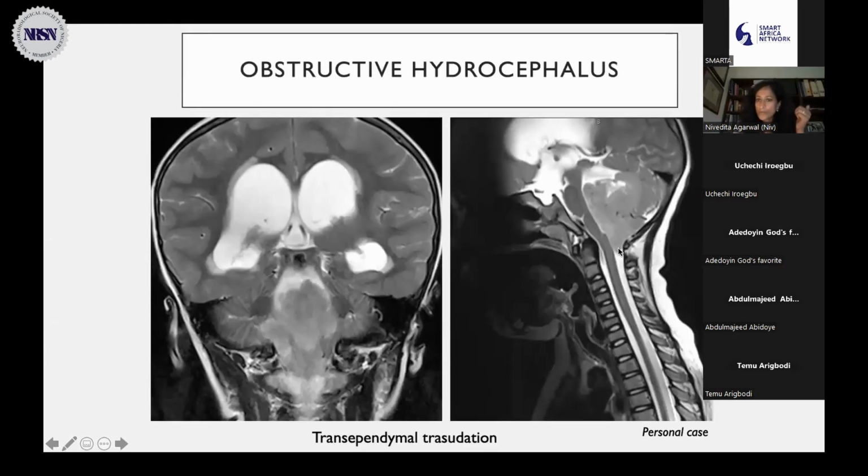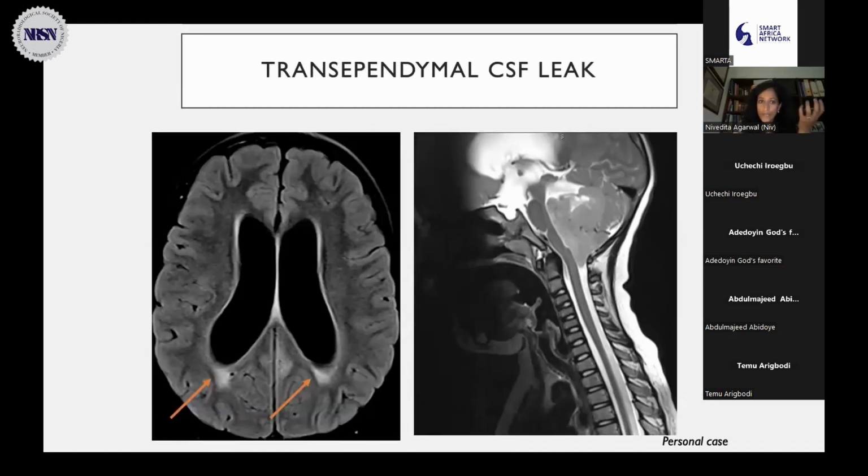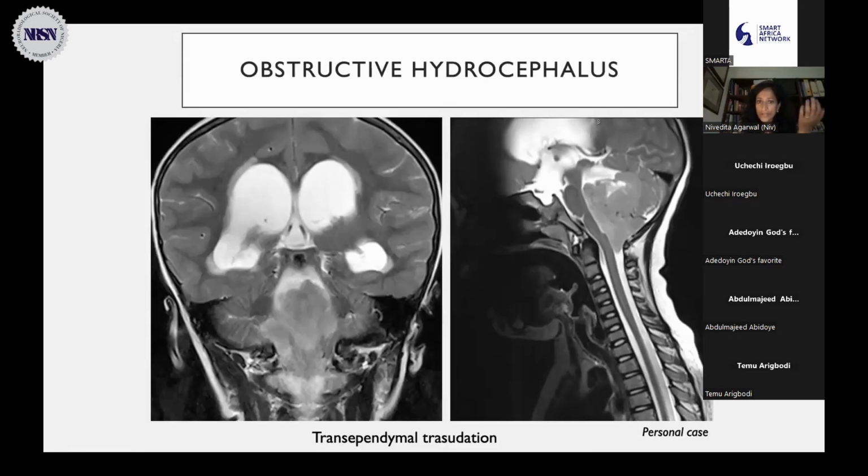This is a tumor, medulloblastoma, in a kid in the fourth ventricle. Again, very easy, right? You see this obstructive hydrocephalus, you see this great mass, you go to all lengths in measuring the tumor, etc., which is important. But it's also important to understand how the brain is actually reacting to this tumor, how the brain as a whole. And these are all causes of hypertension. And these are patients that come with headache. That is the reason why the patient has headache, right? And that is because the pressure is too high. And that is right there, your intracranial pressure.